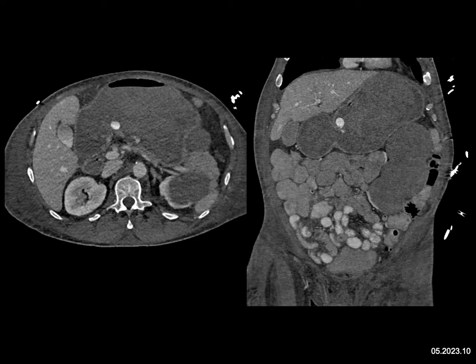Now, if you ask me, could this be lymphoma, I would say unlikely because the stomach is not markedly thickened. It's not a pseudo-bleed, it's a real bleed. High-density fluid in the stomach can be due to ingested matter, but not that active bleeding site. I don't see a bulky mass, so I would say this is probably a benign ulcer. But you can make a mistake. Tumors can be infiltrating. Patient will need endoscopy.